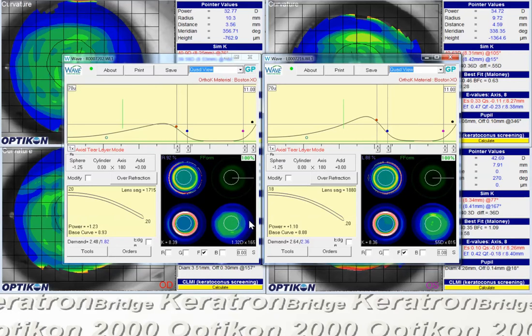I think freeform is fine for this patient since the nasal and temporal aspects of the cornea look fairly asymmetrical. In the left eye, there's a little bit of lack of homogeneity to the base curve, and sometimes that happens if you switch from GSIM to freeform. Just keep in mind, anytime you make changes down here, you don't want to just click the box. You should go through the tools and configuration settings. Changes up here can be done manually, but it's best to have a way of redesign a lens if you're going to change from GSIM to freeform or RSIM to GSIM.